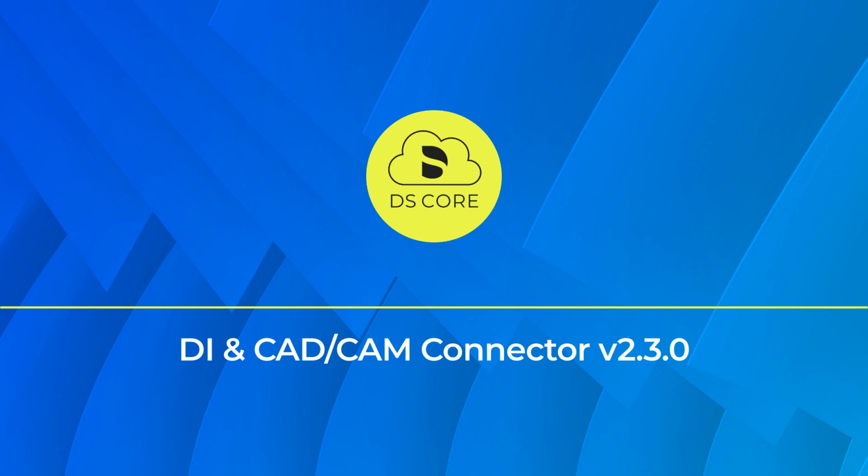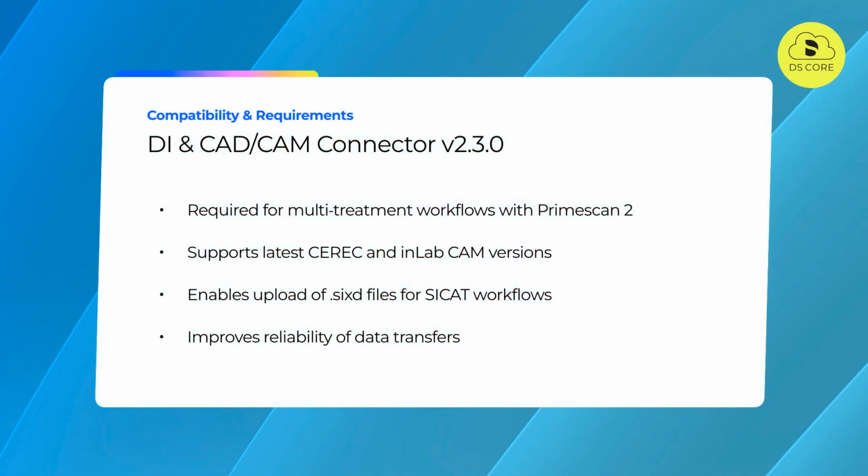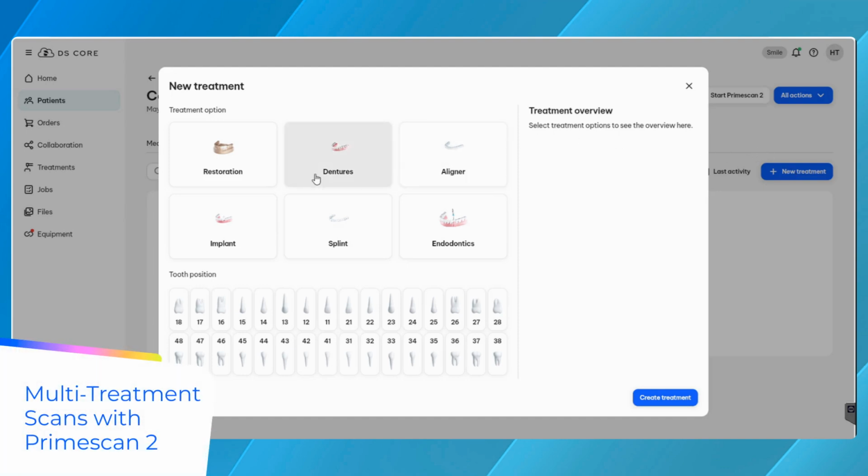Let's get started. This update significantly improves the reliability of data transfers between your on-premise software and DS Core. This is especially important for teams scanning in CEREC or Connect software and placing lab orders. Through various bug fixes, this version reduces upload interruptions and your files arrive consistently in your DS Core patient's media library.